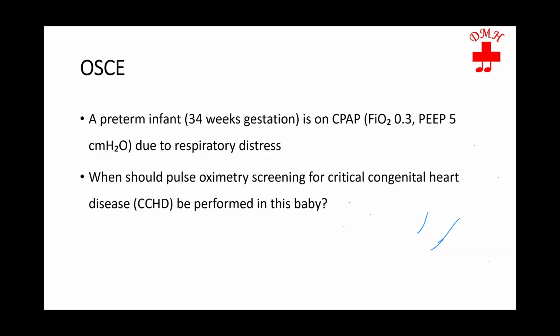Okay. So we'll talk about it later. And then there are a few X-rays of a term baby who has failed a critical congenital heart disease screening, and then you have to tell me the diagnosis of that patient based on the X-ray findings. Okay, we'll go through this.